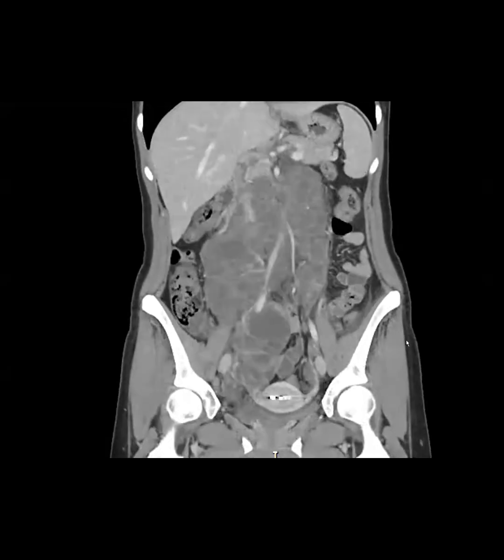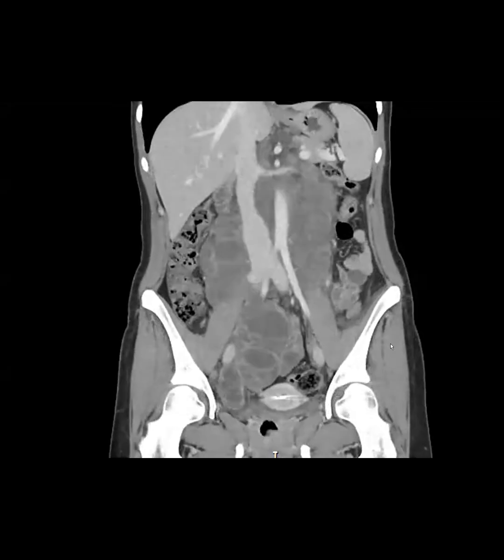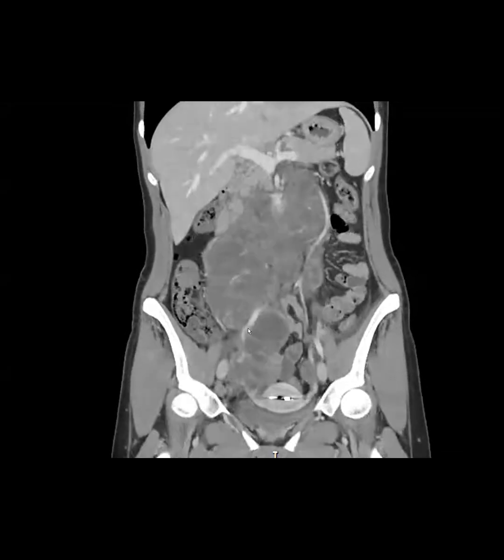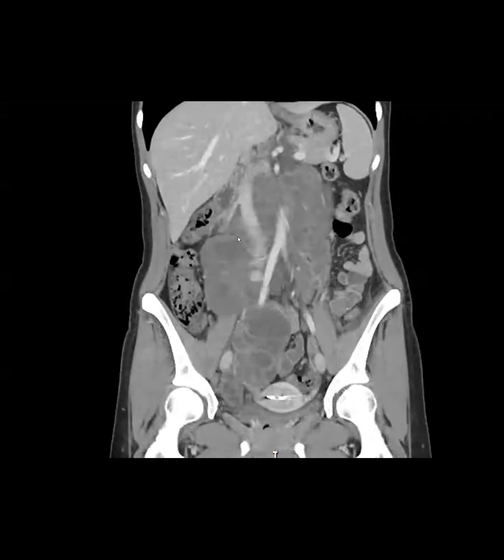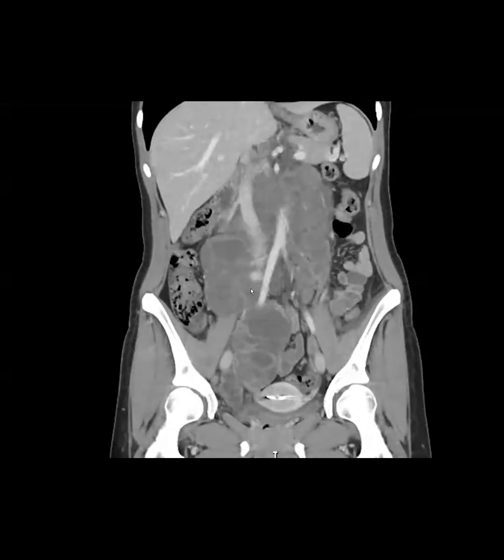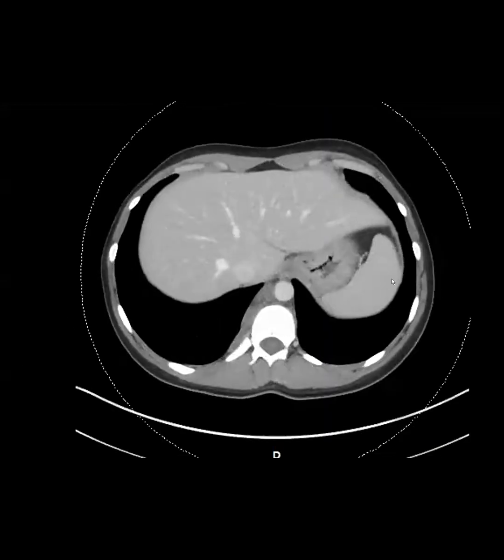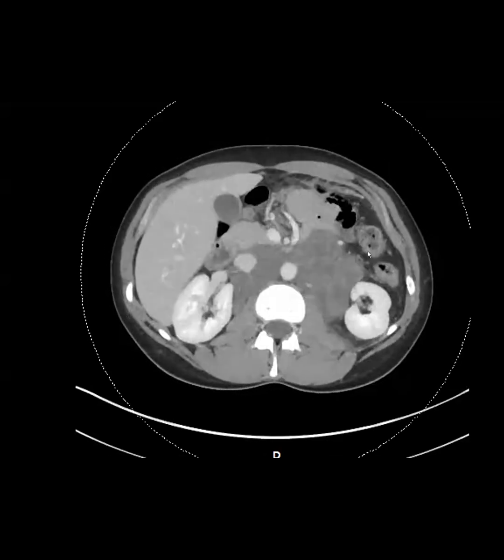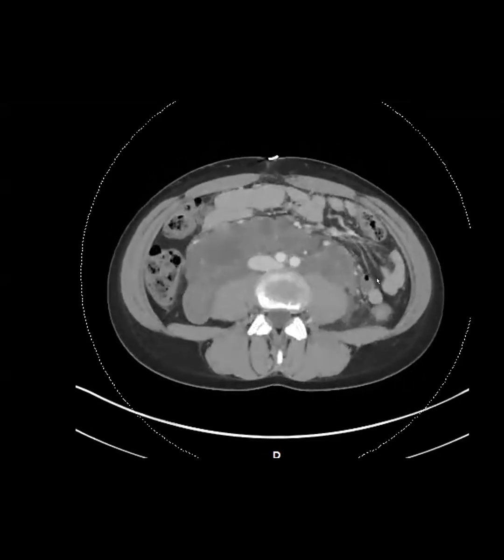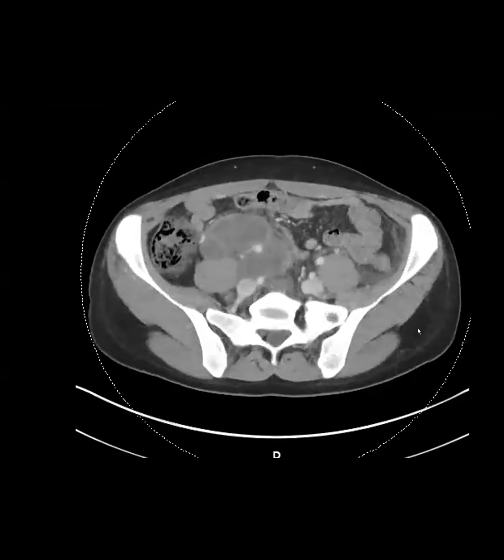Wait, so those are all sequelae of LAM? Yeah, this is all LAM. It is solid cystic. It can be just cystic. If it is just cystic, then it is probably easier to identify. Here, it just looked like some solidity, in terms of enhancement of the septa, and the way it is so lobulated. But the hint, in retrospect, was the vessels were not badly compressed or something. But again, it's so difficult.